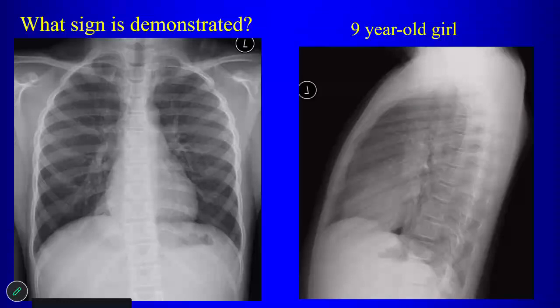Well, I can, yes, because I can still make out the cardiac border. Yeah, you can see the heart border through the mass, so it's not in contact with the heart. This is analogous to the cervicothoracic sign, right? Above the clavicle, if it interfaces with air, it's posterior. Same thing is true when it projects below the diaphragm. If it's interfacing with air, that also implies that it's posterior and you have a spine sign.